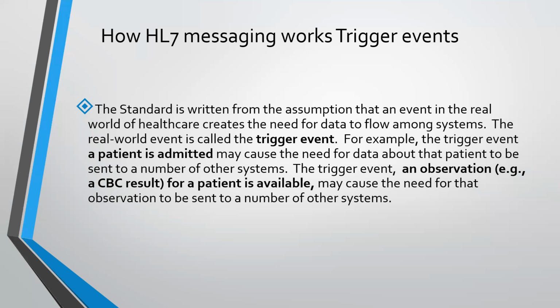So what are the trigger events that we talked about in the first session, in the first slide, in the hospital workflow? Patient registration is a trigger event because data has to be sent. Update of existing patient details are trigger events. Patient's order being placed, patient result being received, these are trigger events. Appointment related transactions, those are trigger events. That is the reason we have seen that there are more than 80 trigger events, which would cover the entire hospital related transactions. Each trigger event is dedicated to one specific event that is happening in the real world.